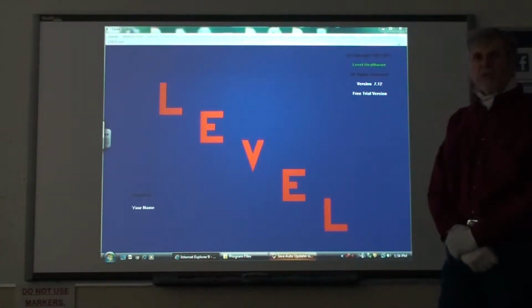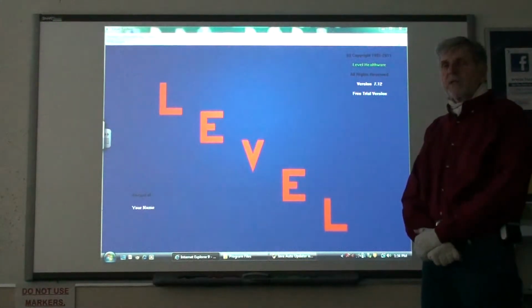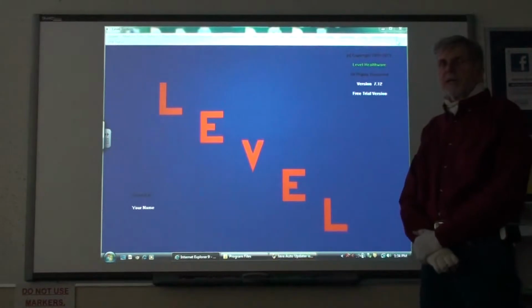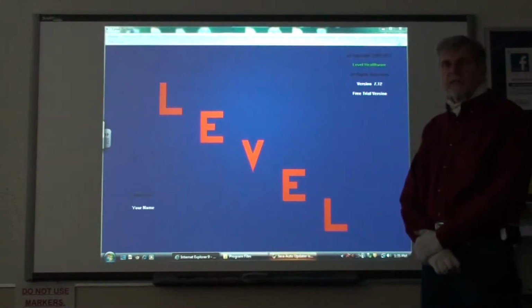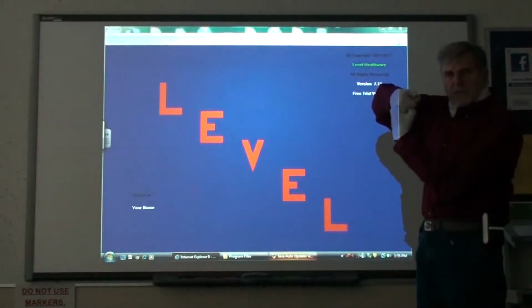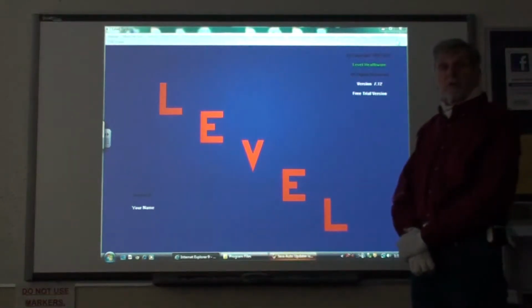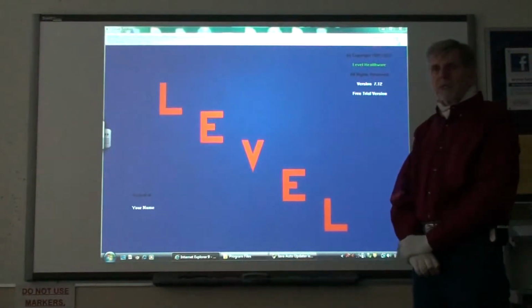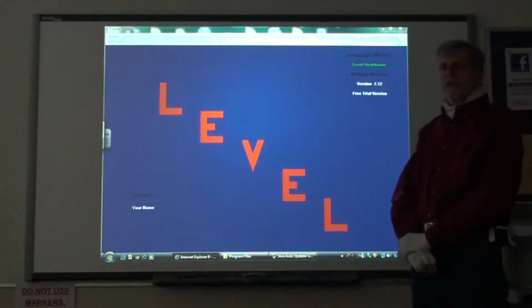Line graph with events in numerics is the tool in Level specifically designed to aid in the control of blood glucose levels by type 1 diabetics. The glucose level in your blood is struck as a balance of conflicting forces between the insulin driving the blood glucose level down and the food that you eat driving it up. If these are balanced, then your blood glucose reading will be in your target zone.